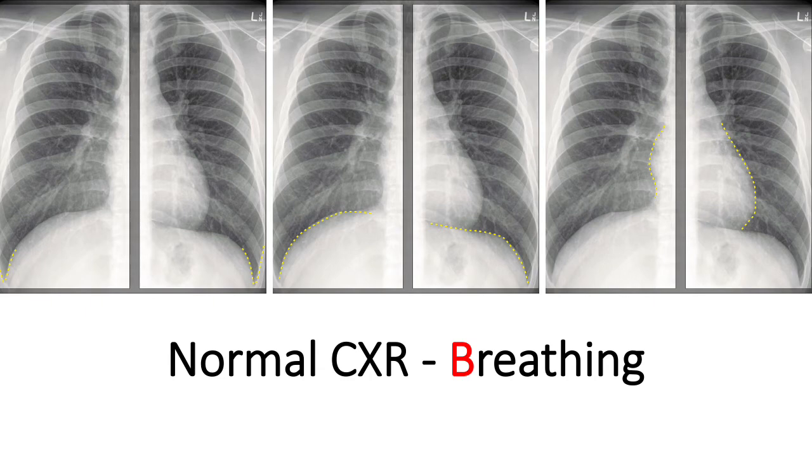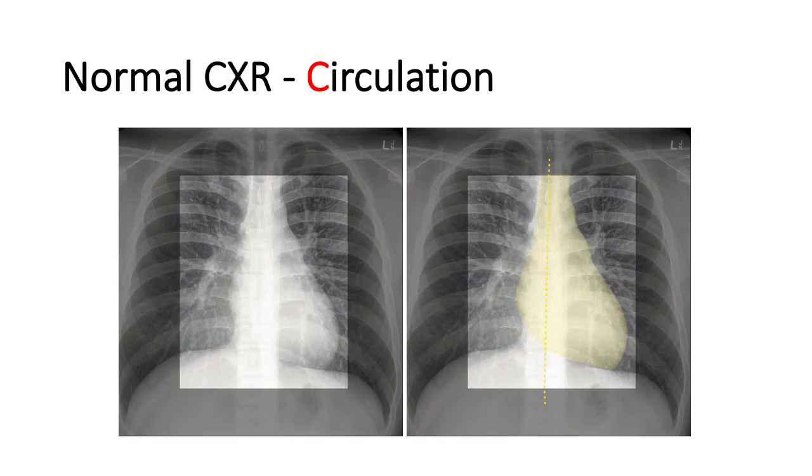Continuing on, trace the lateral margins of the lung to the costophrenic angles. Are the costophrenic angles crisp? Now trace the hemidiaphragms into the vertebrae. Can you see the whole of the hemidiaphragm? Then trace the cardiac borders. Can you clearly define the left and right heart borders?